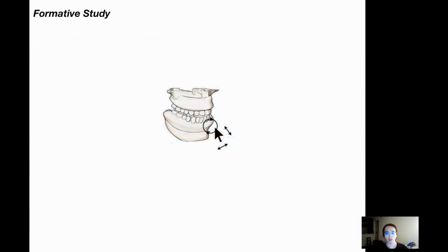To inform the requirements of an ideal education tool, we performed a formative study with dentists, and here is what we learned. First, the tool should be based on a patient-specific 3D dental model. For one thing, the 3D model is more intuitive and complete than 2D ones. For the other, the patient-specific model can better explain why a certain step is carried out or not.